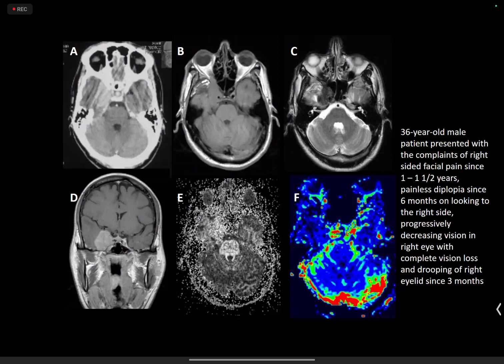Other cavernous, paracavernous lesions? Ma'am, it could be a schwannoma, since it's hypointense centrally. Yes, it can be a schwannoma. It could be some inflammatory pathology, like inflammatory pseudotumor, Tolosa-Hunt. And this turned out to be Rosai-Dorfman disease.